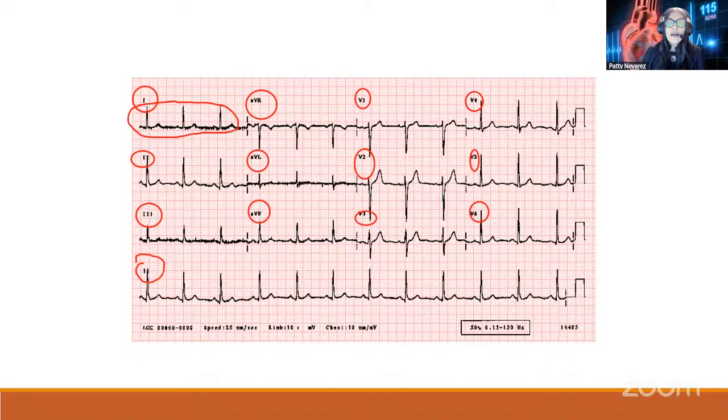It's going to have a big view of the heart. If you remember, it's from the right shoulder to the left leg. So that's going to give us a whole view of the heart. It has a really good perspective. So lead 2, in most cases, is going to be the baseline to obtain the 6 seconds. If you take a look at the bottom lead, it's lead 2, and it's a whole 6 seconds here. So this is what we're going to be using to count the heart rate or to see any morphology changes or whatnot.